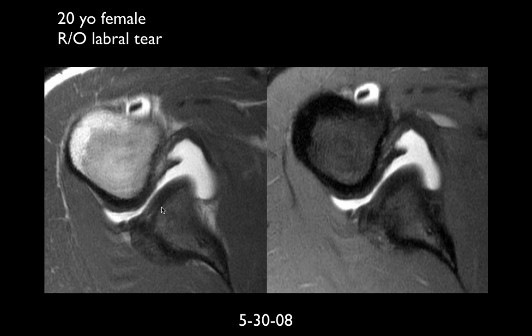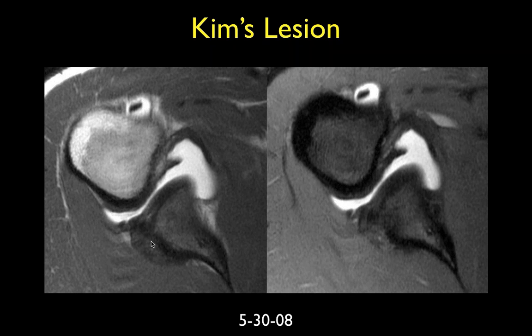And again, like you mentioned, that irregular, almost rounded morphology of the posterior inferior glenoid. So there are a number of changes here that should make you very concerned about posterior inferior instability. And this is really thickening of that cortex there. In this particular case, this is really abnormal underneath the labrum, and we can see some irregularity there.